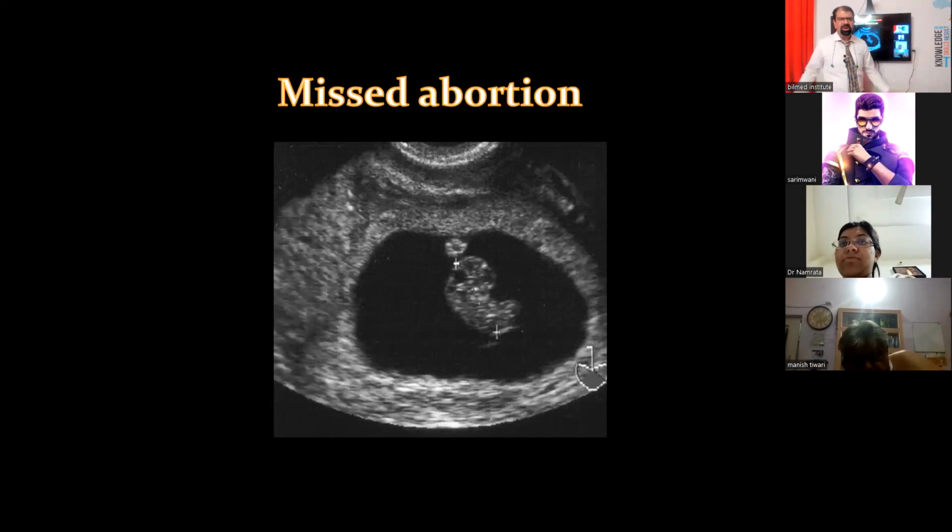But you should know how the yolk sac will help you. The yolk sac is telling that the embryo, the fetus right now, is a dead fetus. And mind my words, even if this fetus is alive, having 120 beats per minute, in the setting of this yolk sac I am having a very, very bad prognosis.